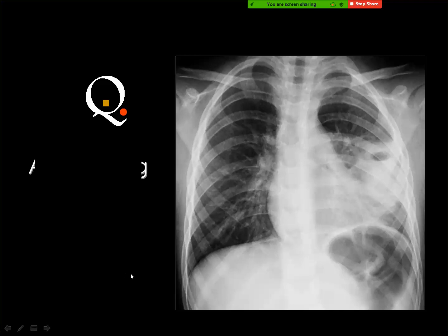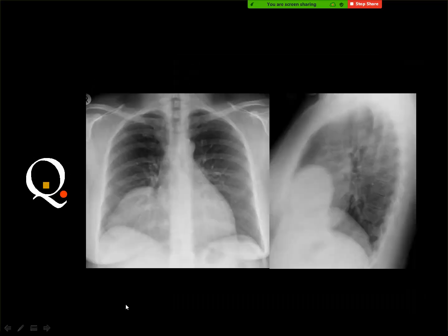Left lung abscess. Yes. And this is a lung abscess which is acute because of the surrounding pneumonia. If you see some consolidation around the abscess cavity, you say that this is an acute lung abscess.